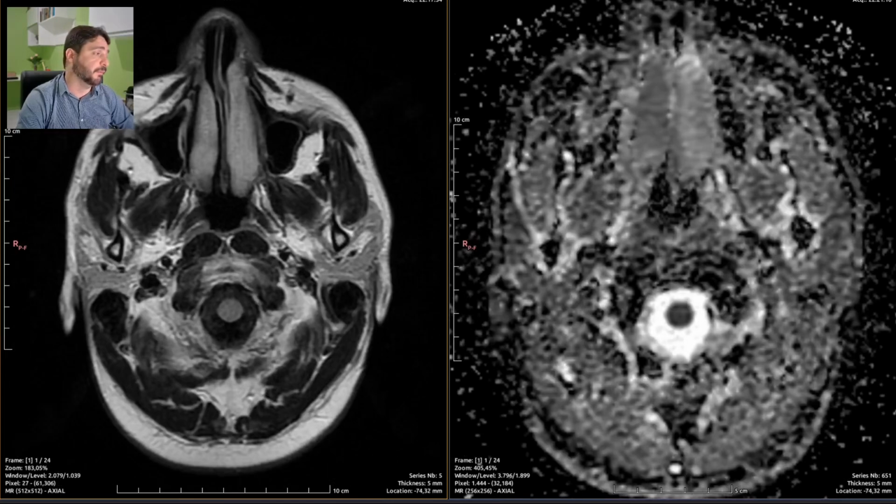So let's just describe it, because as you know, this and any other exam just won't report itself. So let's grab a template. Template has been pasted, and I'm just going to report those tiny bright spots.